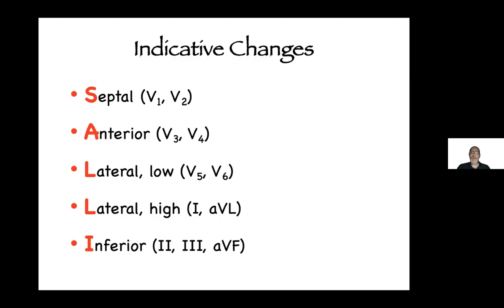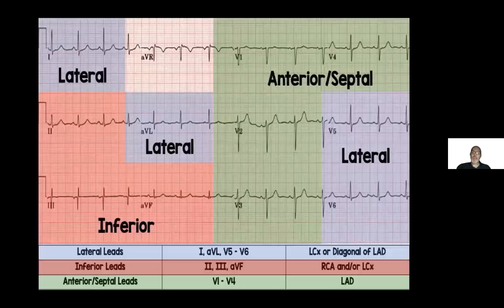So I'm looking for indicative changes. I'm looking for ST elevation. I'm looking for hyperacute T waves. I'm looking for pathologic Q waves. I'm looking for any indicator of either acute myocardial ischemia or old myocardial damage, where there's an indicative change.